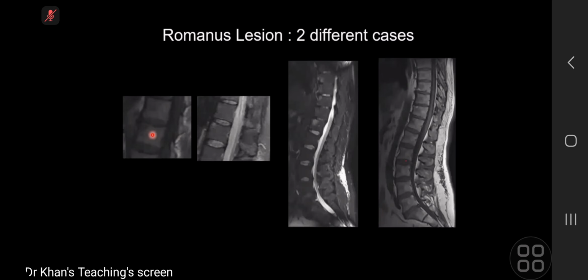So those are focal views, T1 and T2 weighted MRI sagittal, and that vertebral body, which looks thoracic, probably has an abnormality at the anterosuperior corner, which is T1 hyperintense and T2 hyperintense. This is consistent with a Romanus lesion, which I think is the MR equivalent of the plain radiograph shiny corner, which is maybe the earliest signifier of spine disease and seronegative arthropathy.